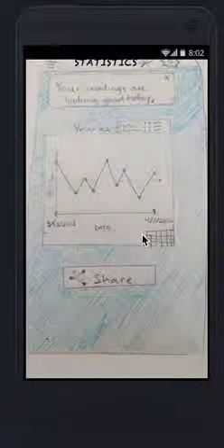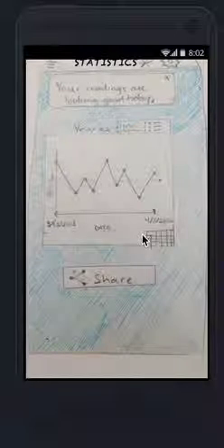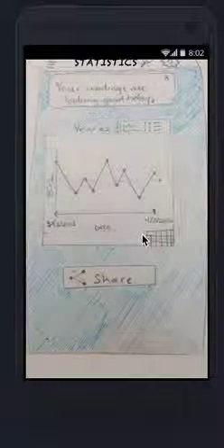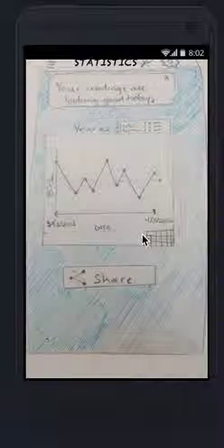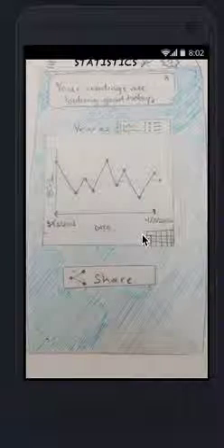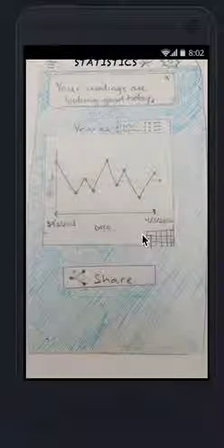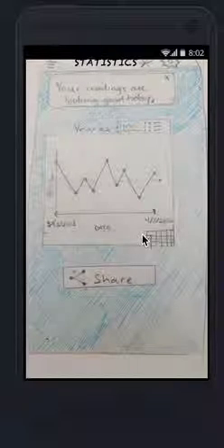This is the BGL monitor group, and the BGL monitor is an app that lets diabetes patients record their BGL in real time and in an efficient way. I'm going to quickly show you a demo of how the BGL works. Because of time constraints, I'm going to try as much as possible to cover this in a period of 5 minutes. So please listen and enjoy.